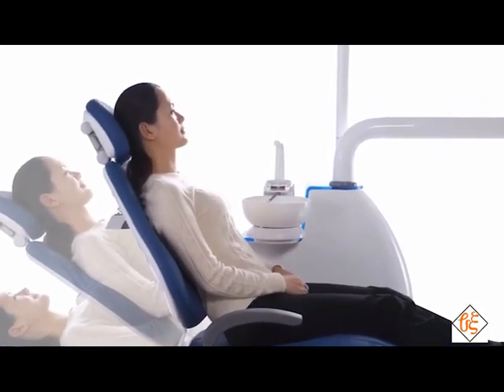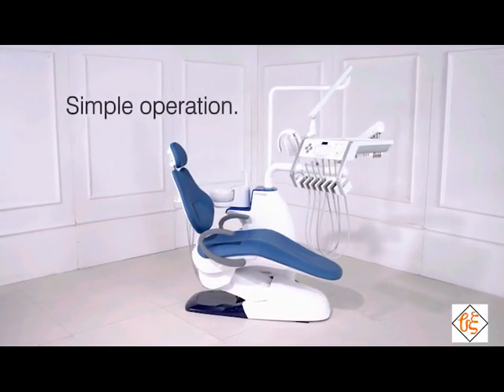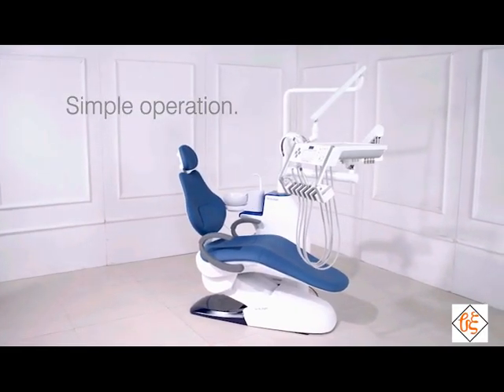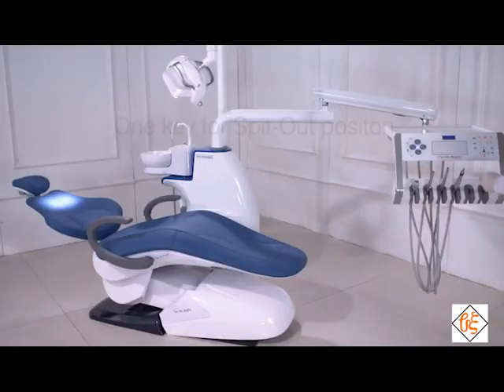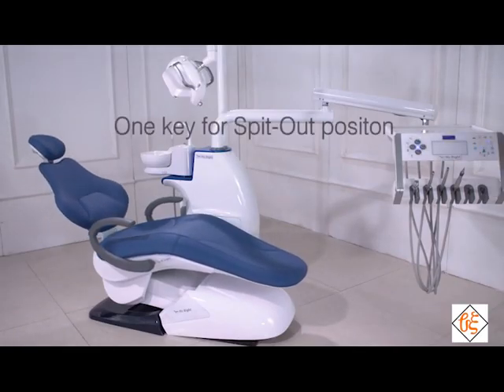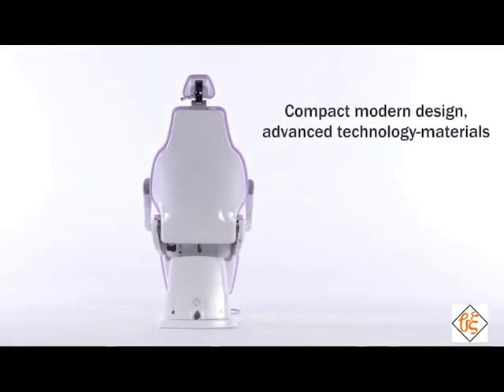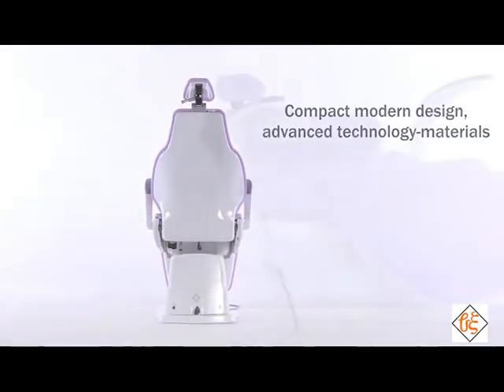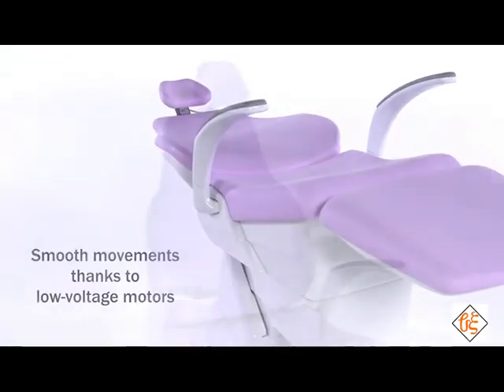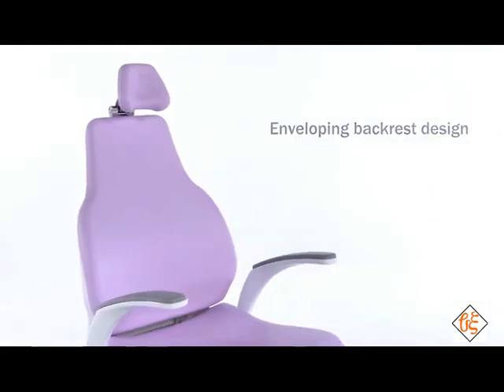Dental chair-mounted design. Unlike the ceiling-mounted dental chair where attachments are built into the ceiling, a dental chair with a mounted design has the dental engine and attachments built into the actual dental chair. Mobile independent design dental chairs are wheel-mounted chairs or folding-style chairs with locking mechanisms. They are primarily designed to be used in mobile operations and are often used in areas where access to dental services is very limited. This was a simplified video on the dental chair.